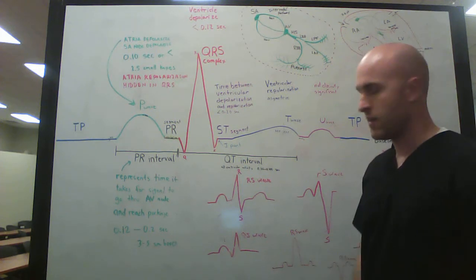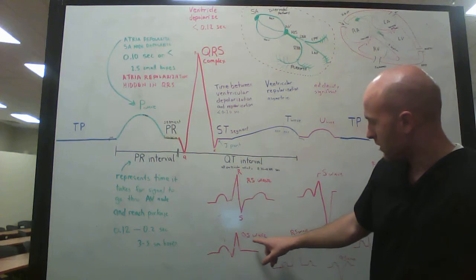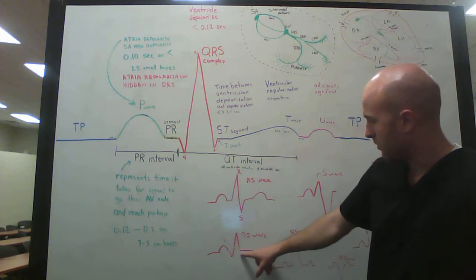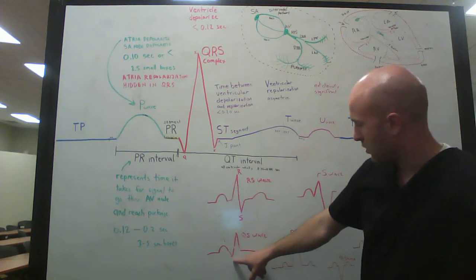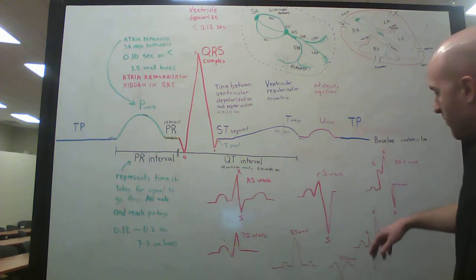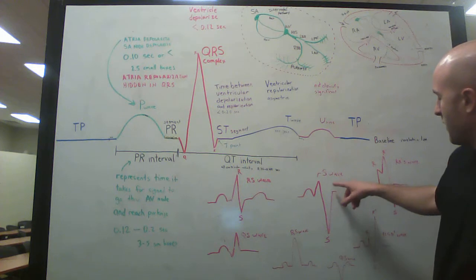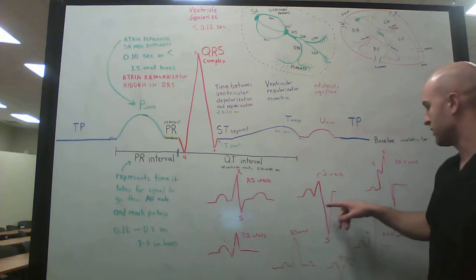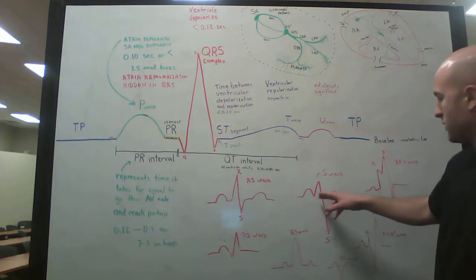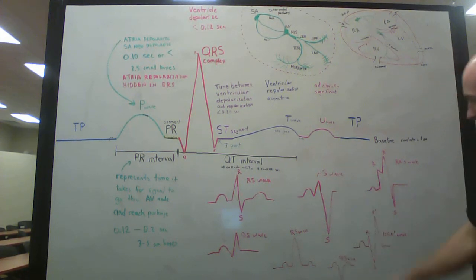In other instances, you might ask, what if it doesn't have an S wave? What if it just has the Q wave? Well, you can record that as well and label that. Or what if it has this huge S wave, or doesn't have the Q wave? You could just call it the RS wave, but maybe with a lowercase r, the way he drew it on the video.